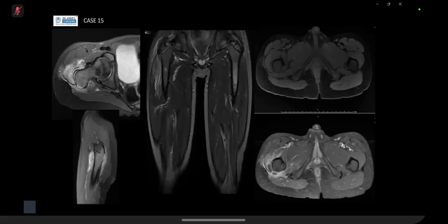Okay, thank you. So this is osteomyelitis. You've got soft tissue edema. You've got this periosteal elevation. And this is a T2 fat suppressed, and you can see marrow edema as well here between the greater trochanter and the epiphysis, the metaphysis. And this is the apophysis, which is similar to the epiphysis, just that it doesn't add to the lengthening of the bones. So this is the apophysis, and this would be the metaphysis, as you normally know in your long bones. Soft tissue edema, that shows you again on a coronal.